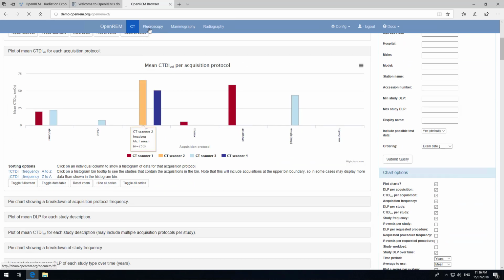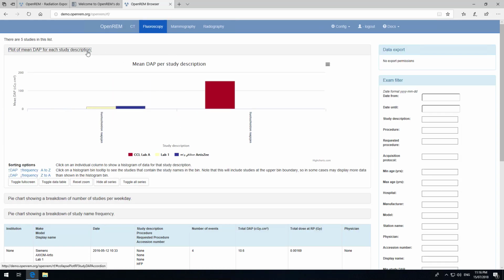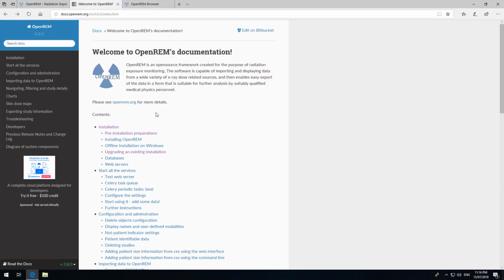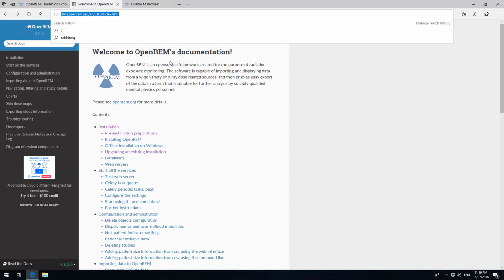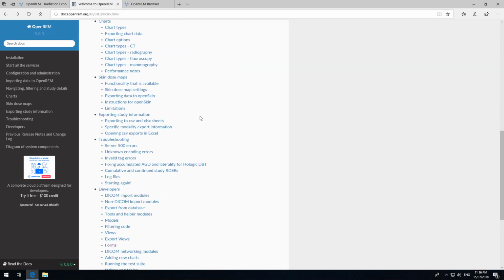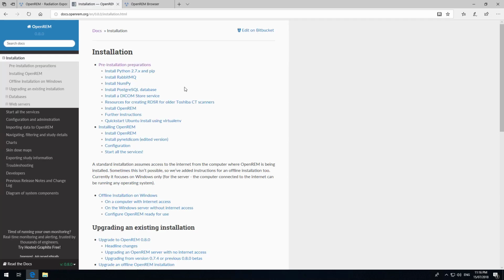We'll work through installing OpenREM, supporting frameworks, as well as cover a couple important integration pieces. This tutorial is primarily built from documentation available via the OpenREM doc pages, with only some minor deviations. Any downloads, scripts, or other reference material you might need will link in via the video descriptions.